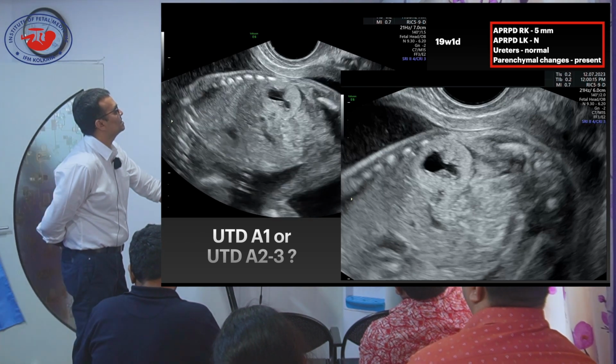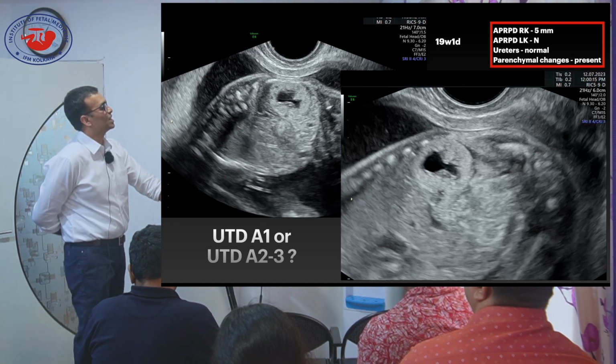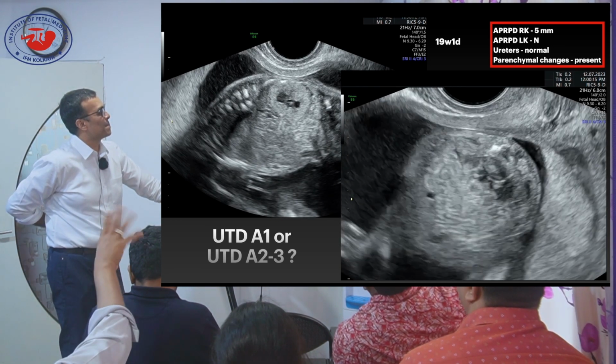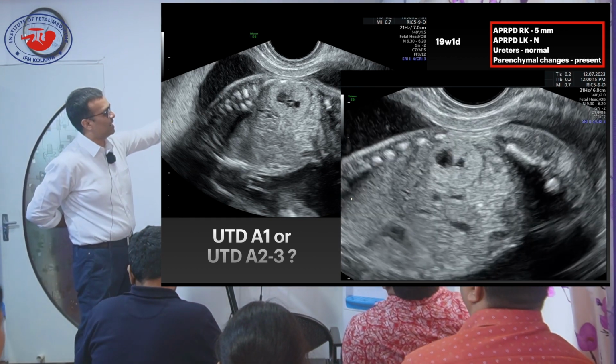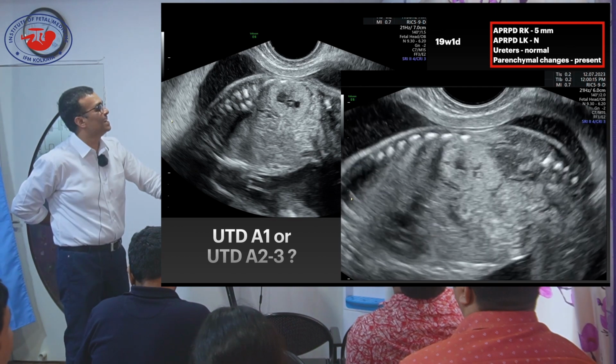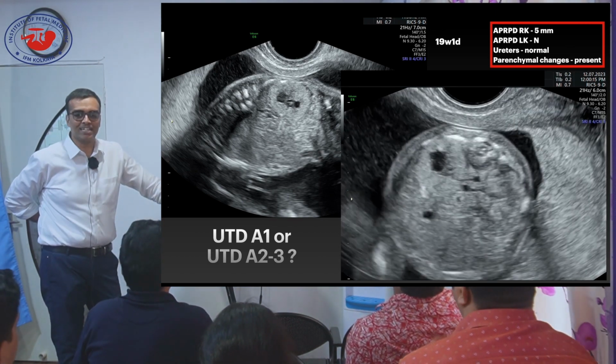Yes. So you have to tell me, like if this is echogenic, that should also be looking echogenic. See, I have already put the answer there, the parenchymal changes. I have not put the answer there to confuse you all. I have put the answer there because it is the right answer actually.